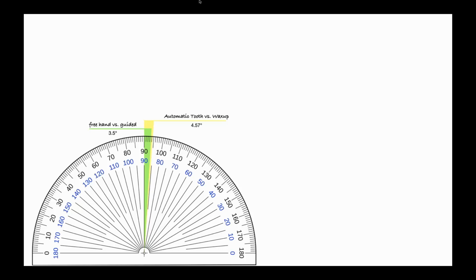In other words, it's from a library of teeth that you can just drop into position without reference to occlusion or maybe gingival aesthetics, compared to implant position that we would look at based on a full diagnostic wax up. And this is based solely on the digital plan, not on the implant placement, approaching 5 degrees.